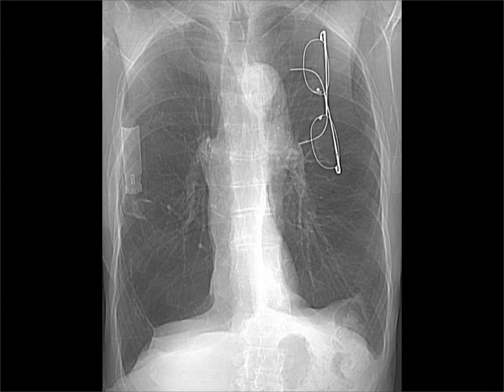On the other hand, there are a few things, and emphysema is by far the most common, which can make your mediastinum, your heart in particular, look too small. See, this cardiothoracic ratio is probably more like 0.25. Now, in this patient who has emphysema, their mediastinum has kind of been stretched, so the volume of the heart is probably normal. It's just that the cardiothoracic ratio looks abnormal. In these patients, you really need to be very aware of this, because for this patient, cardiomegaly would certainly be when they had a 50% cardiothoracic ratio, so you can underestimate it in these patients.